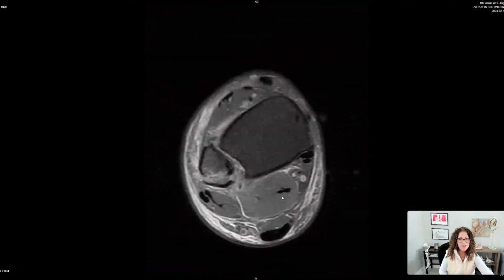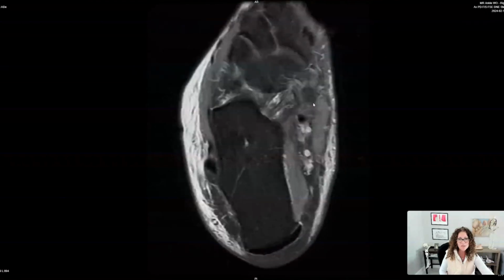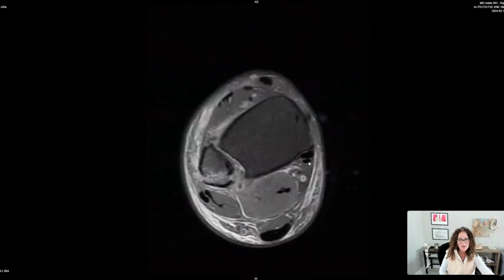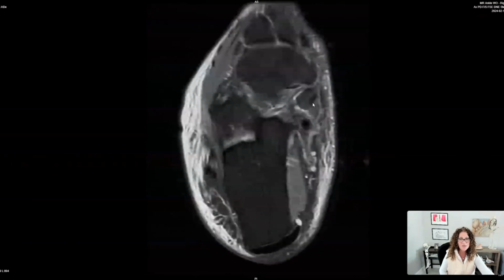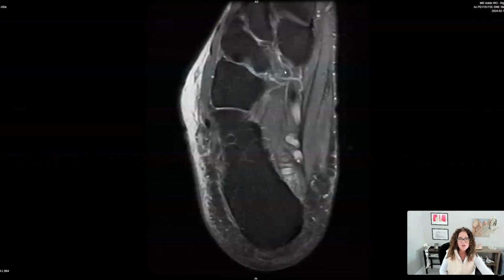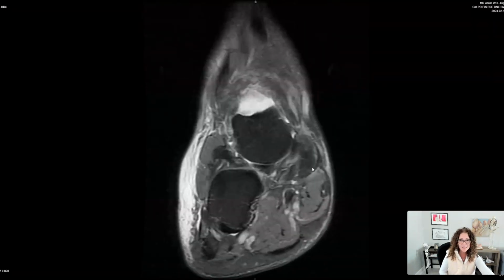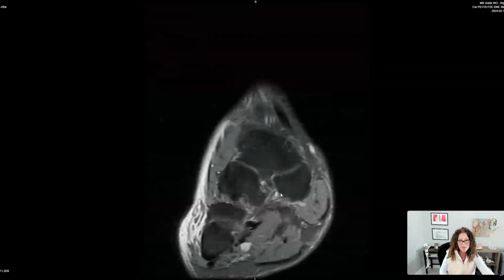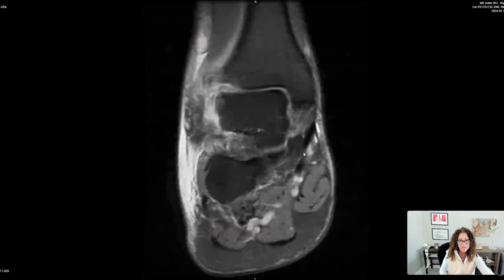So I'm going to just dive in. I see that there are things, but I don't get myself distracted. I'm going to go to my posterior tibial tendon, and I'm seeing that it's about twice the size of my flexor dig. So there is some degree of tendinosis of the posterior tibial tendon. There is an os navicularis, and then the majority is going to go, the second 50% is going to go to attach on the undersurfaces of the metatarsals, and we can see it as it comes down. 50% attaches on the navicula, and then other branches are going to go on to serve on the undersurface of the arch towards the cuneiform and metatarsal attachments.